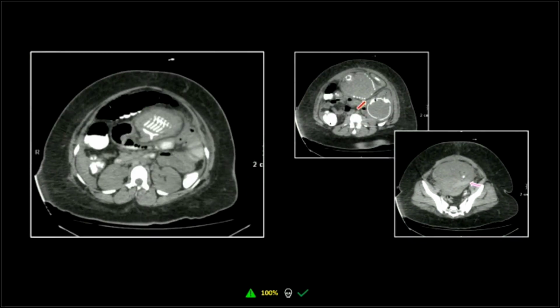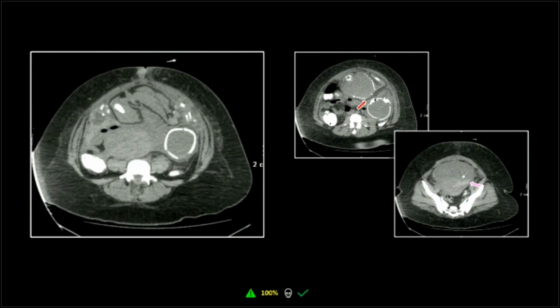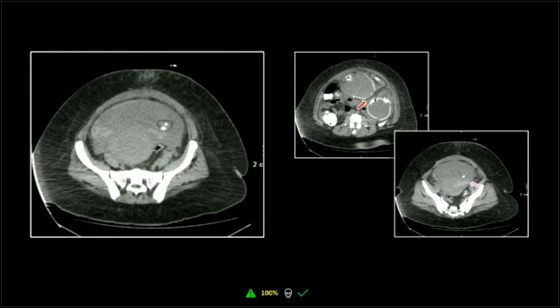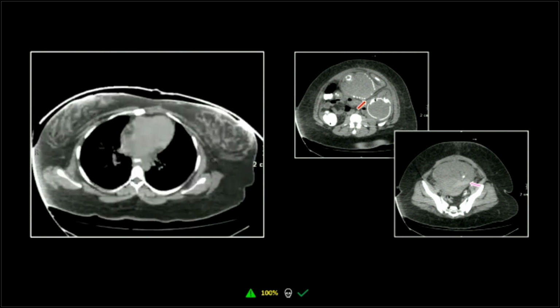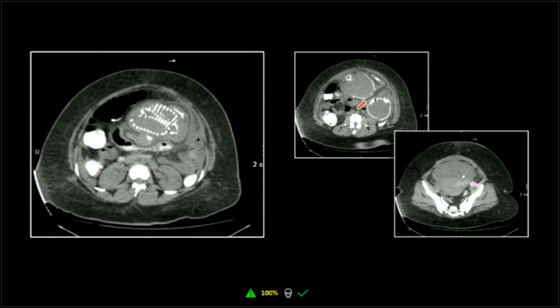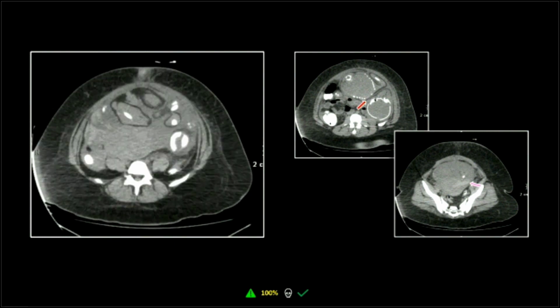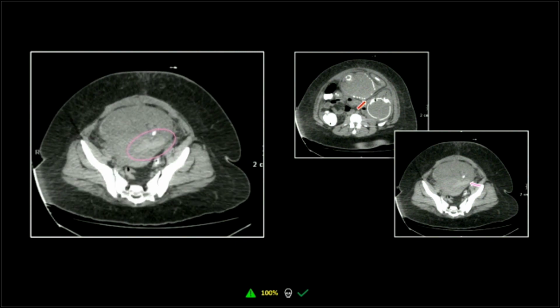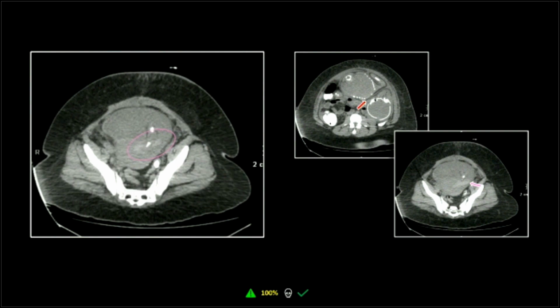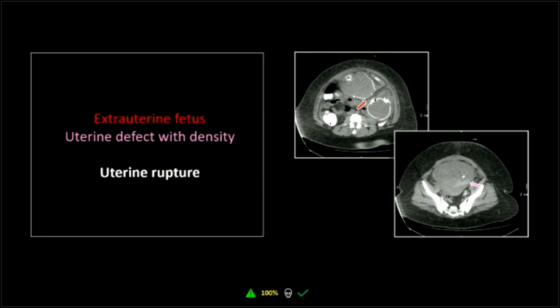So these are, I've actually seen probably 3 or 4 of these in my career at this point. You can even see overlapping sutures in the fetal skull, suggesting he's not doing too well either. And then there again is the clot traversing the uterine wall there. And look at the overlapping skull bones there. So neither patient made it here. And that is typical. The NCBI says this is basically not survivable. All right, so that is a uterine rupture.